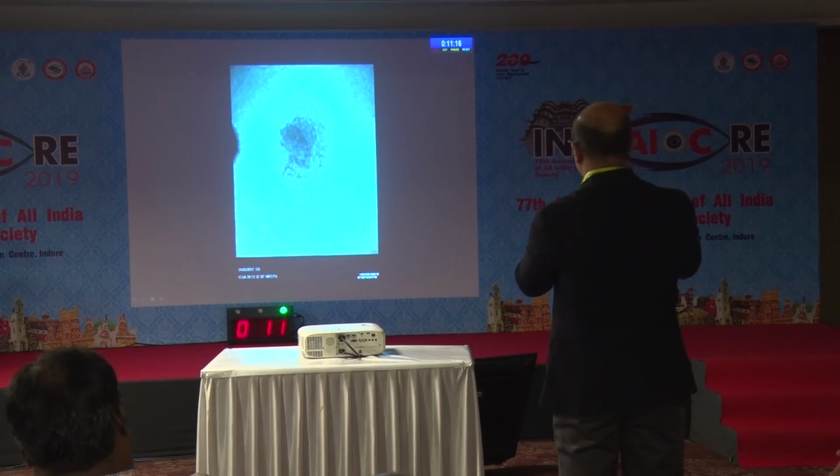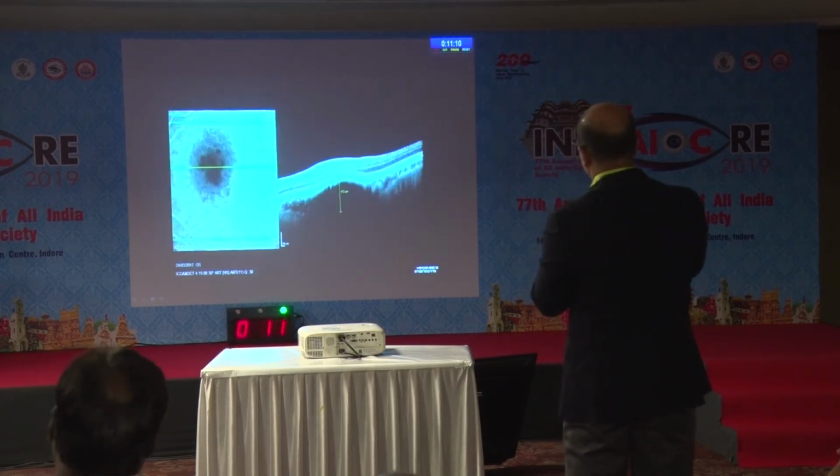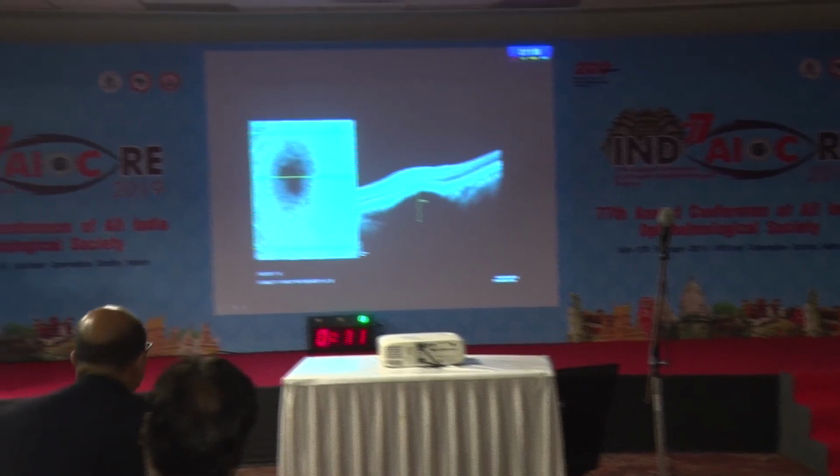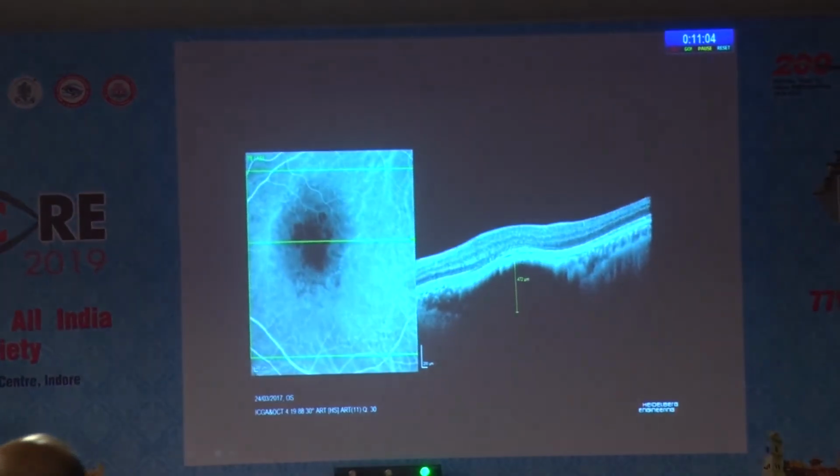So it's very unfair to surprise a person with an ICG, but that was pretty well said. And probably nowadays you think that you don't need anything else, you need only the OCT. So this was the OCT picture. So can Dr. Anand?